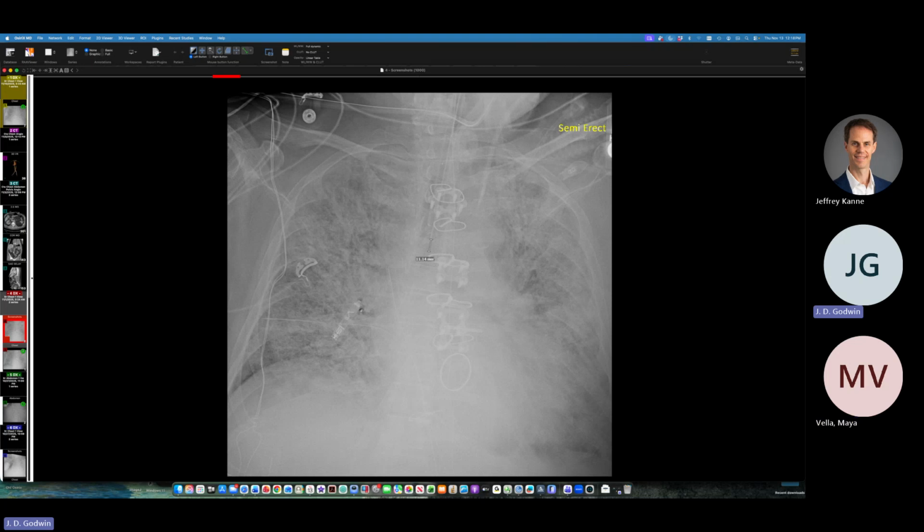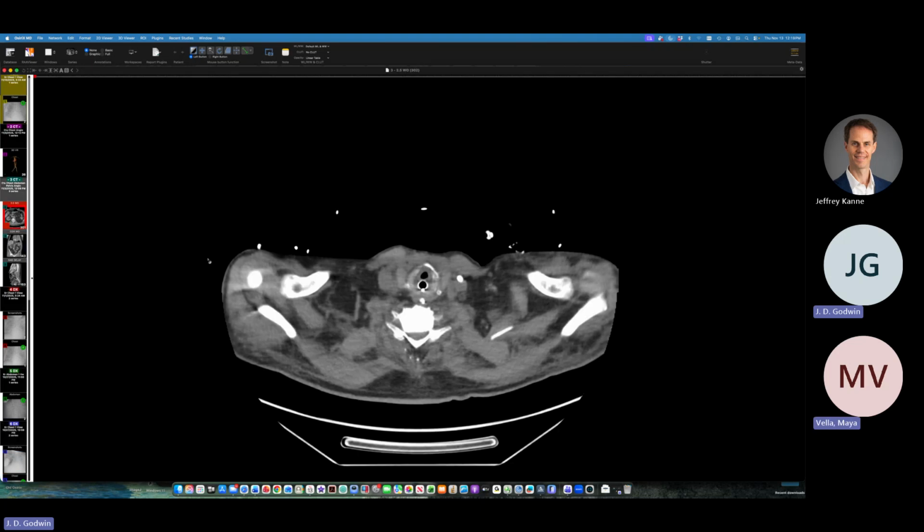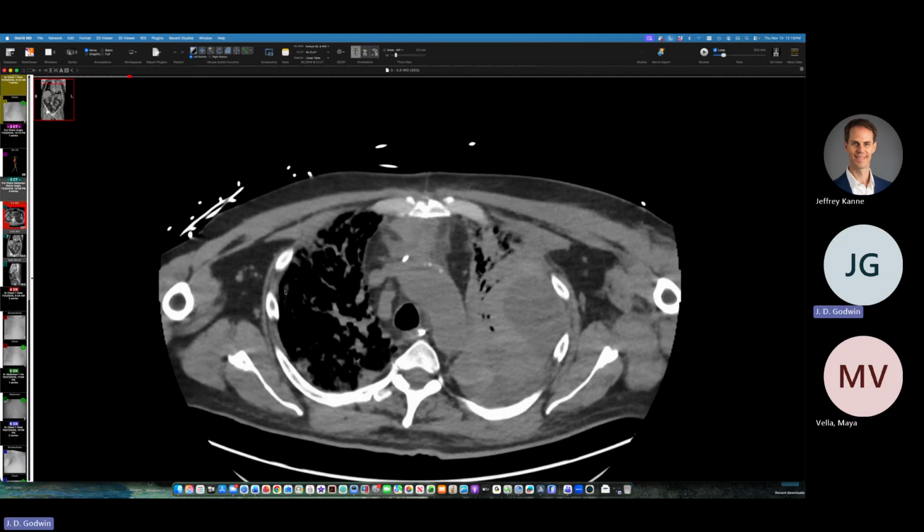Now, I don't know whether this was the atrial one, because the atrial one's gone now. So I think this probably was the atrial one. But they installed an atrial and a ventricular one at the beginning, and I never really clearly saw the ventricular one. I don't think this is it. And I don't see it anywhere else, but I sort of wonder which one this is. But this embolized to the right pulmonary artery.